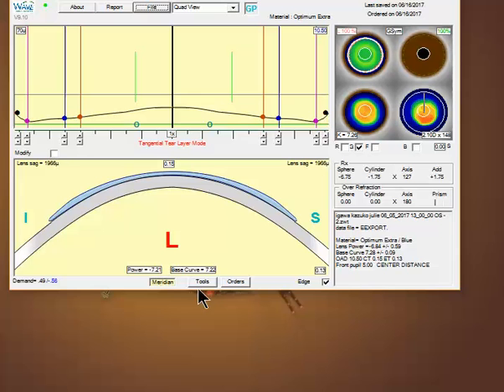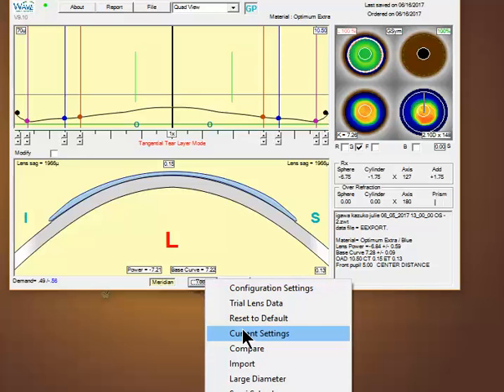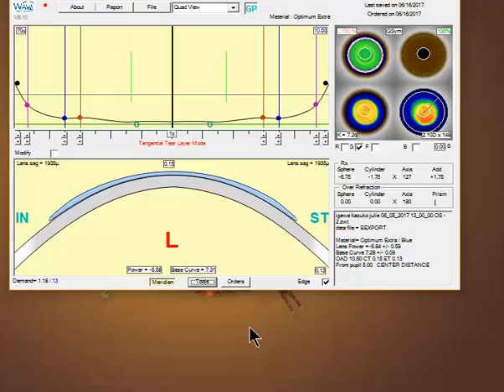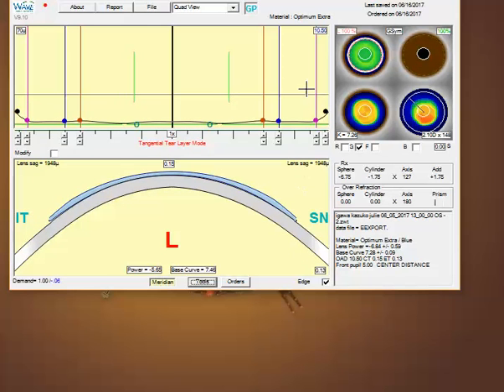So I'll go through here and hit Tools and let Wave redesign. And once it's done redesigning, I'll look once again at this landing zone between the blue and the pink dot. So now this area should be probably a little more precisely aligned with this blue area in the outer topography. And once again, we'll click up a couple times, 2 or 3 times in this pink dot.